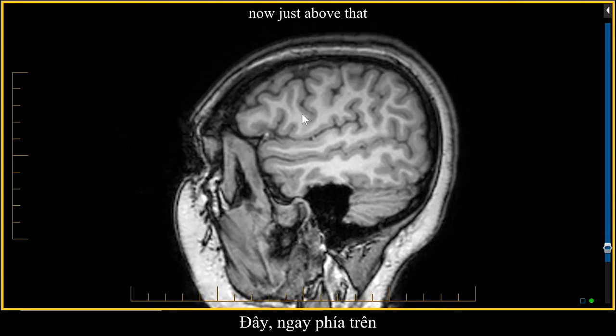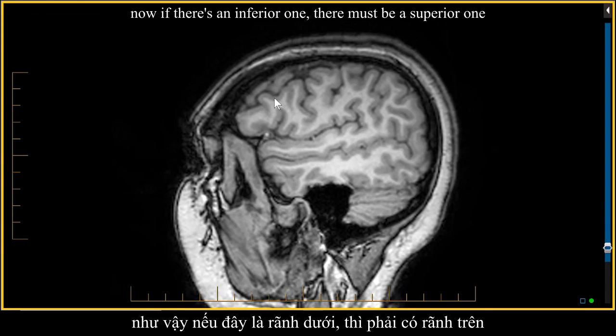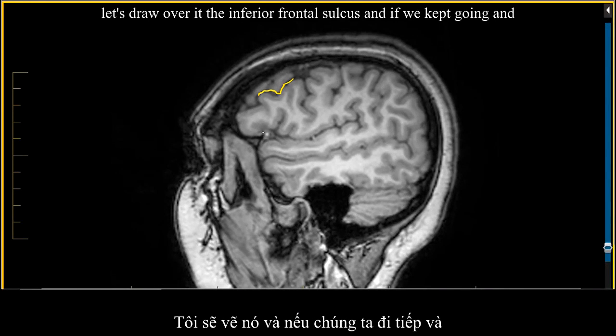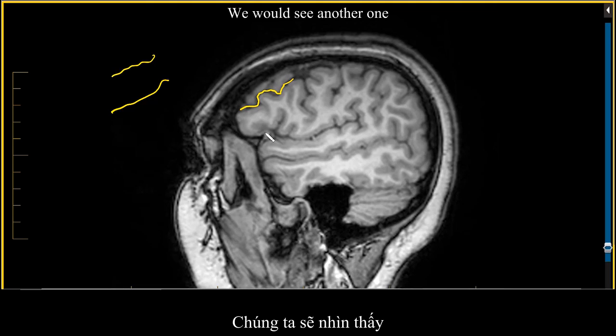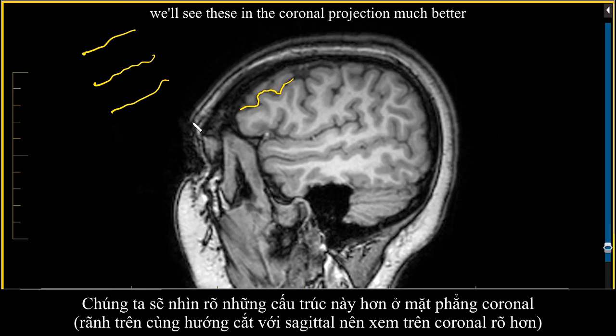Now, just above that, we've got the inferior frontal gyrus and the inferior frontal sulcus. Now, if there's an inferior one, there must be a superior one, right? Well, here's the inferior one. Let's draw over it, the inferior frontal sulcus. And if we kept going and we scrolled inward and we weren't volume averaging against the direction of the sulcus, we would see another one, the middle sulcus, and then another one above that, the superior sulcus. We'll see these in the coronal projection much better.